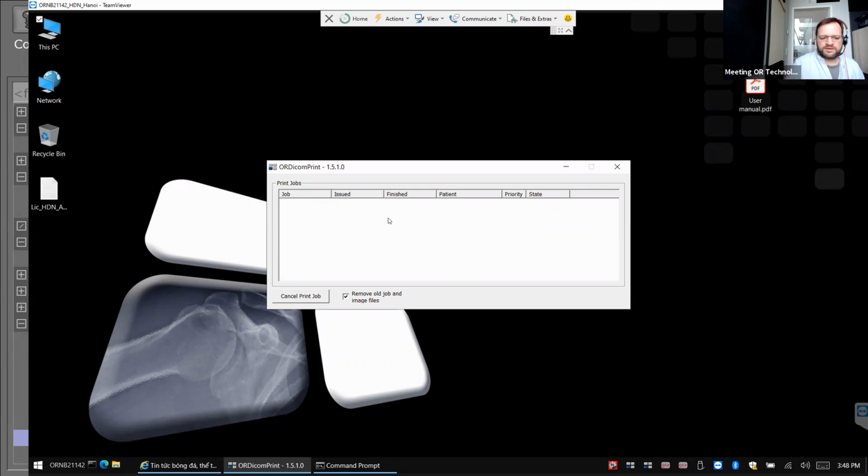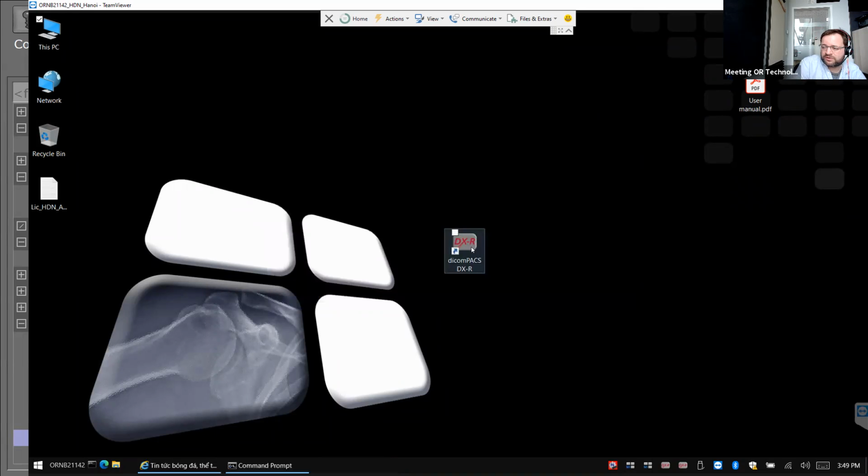Yeah. So with the Amadeo Mini, normally when you start the software, it will check every component. So it will check if the detector is all right, if the generator is all right, if the synchronization is all right. And when you get no error message, everything is fine. Otherwise, you will get an error message. For example, now you don't have the generator enabled or switched on, I think. So when you start the software, it will give a generator error.